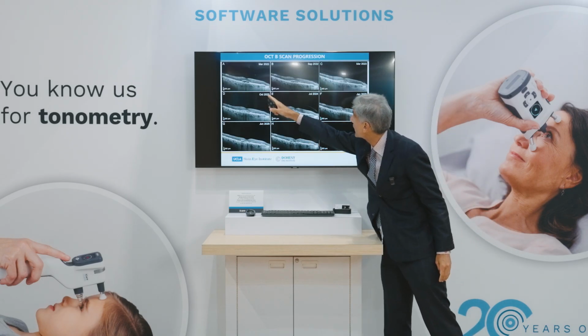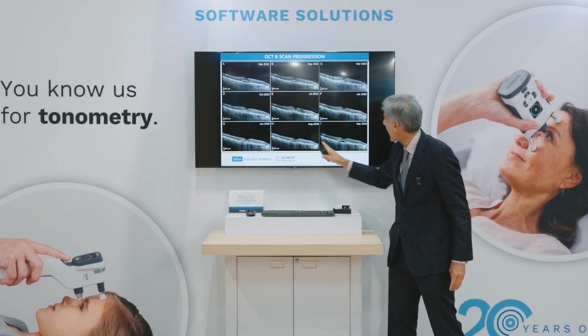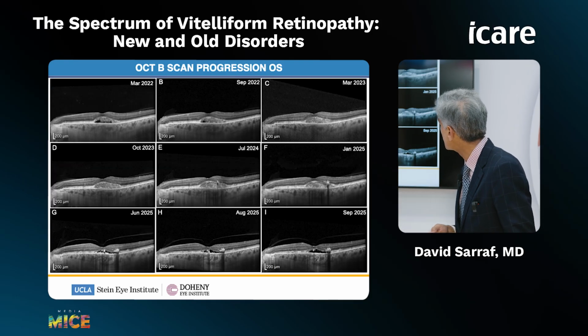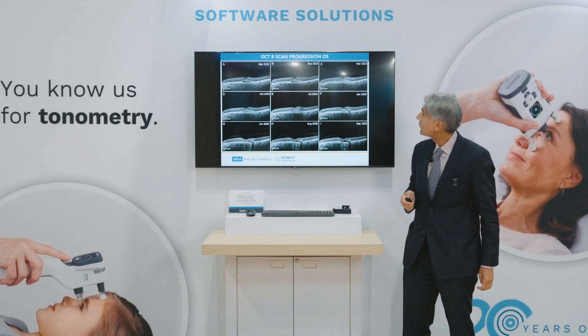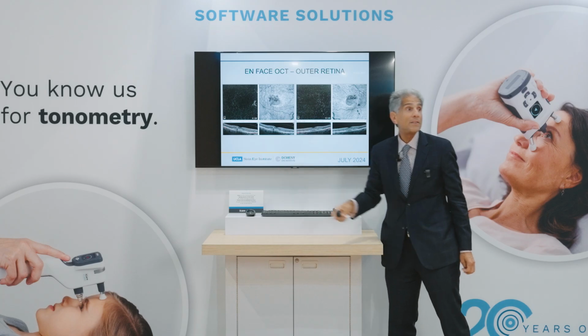And here is the patient. Again, you can see the evolution of the vitelliform lesion and then kind of liquefaction, which is a very common outcome of vitelliform lesions. And this is in the other eye. This patient also had neovascularization. You can see that there right at the disc margin.